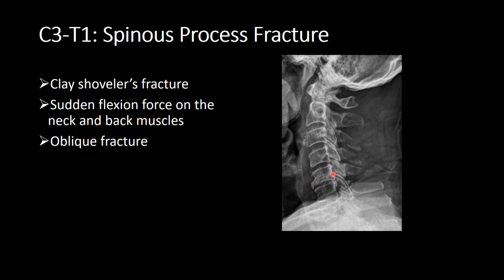Go up the posterior vertebral line, that's normal. Let's look at our spinolaminar line. We've got a lucent line in our spinolaminar line there, but actually this is normal. Let's look at the interspinous distances. They're not too bad actually.